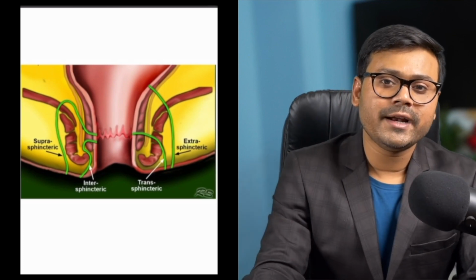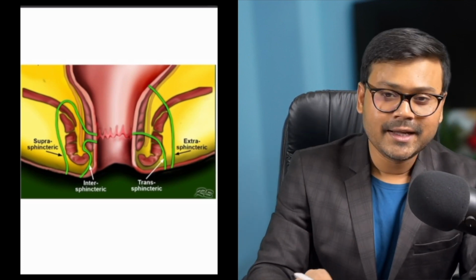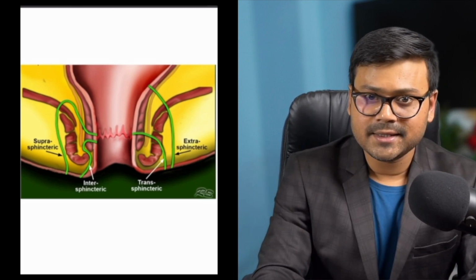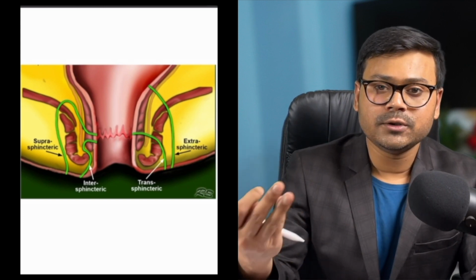And now I think we are ready to see the different types of fistula. We are ready to take the challenges. Let's look at the schematic images first. There are two types of classification. One is surgical classification and another is radiological classification.